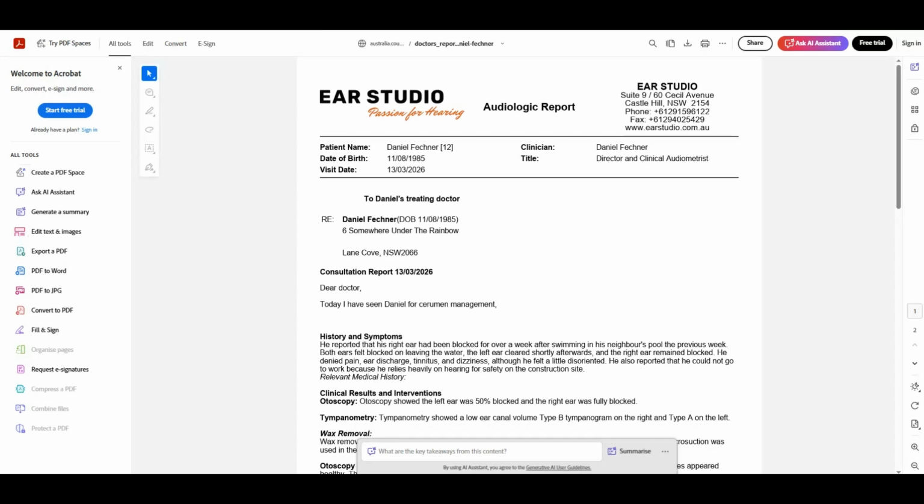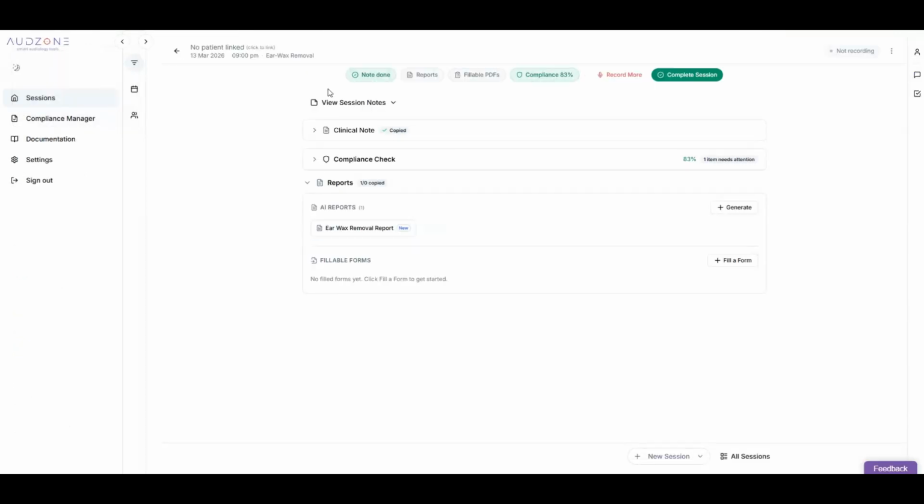Okay. So this is just a little bit of CounselEar practice. And if you have any questions, please feel free to reach out. But I just wanted to show you how to copy and paste the reports and the notes into CounselEar.